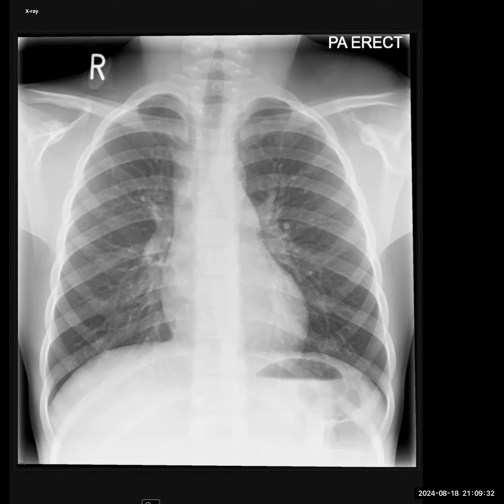I would correlate with the clinical reports of the HPE since this is a post-op patient. I'm trying to look at the lung. I don't see any obvious metastasis. In osteosarcoma, there would be sclerotic metastasis. So I would convey these findings to the clinician. There is no obvious... Can you please show the post-op images again?